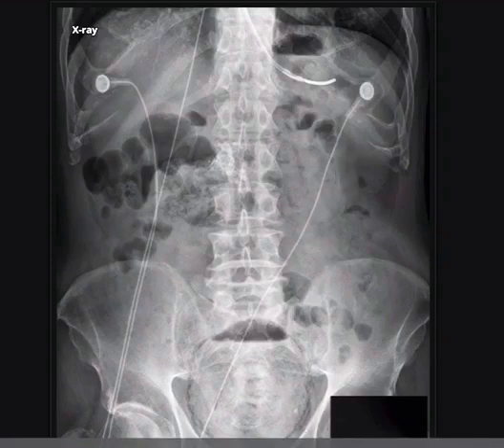There is curvilinear lucency or gas density noticed in the pelvis following the contour of the urinary bladder with air fluid level. The bowel gas pattern is unremarkable. No other abnormal gas density or air density could be detected. No abnormal calcifications could be seen. The osseous structures appear unremarkable. No other abnormal soft tissue shadows could be seen.